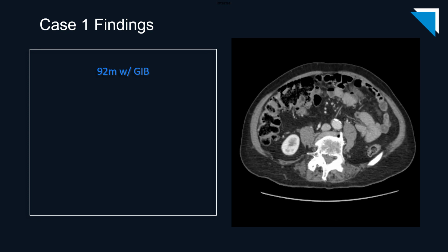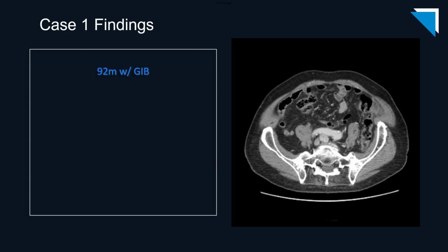Speaking of the devil, here are some more delayed axial images.